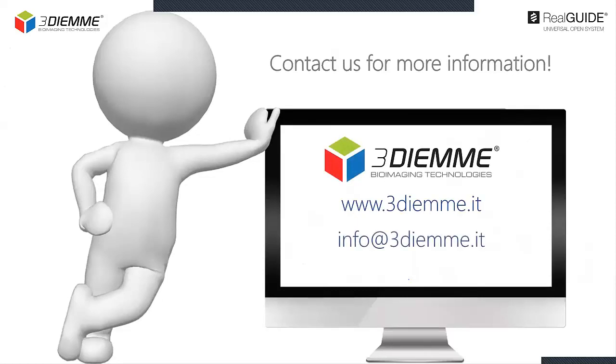And I pass the word on to my colleague, engineer Alice Sormani, who will show you our complete Real Guide digital workflow, starting from data import up to the creation of the surgical guide.